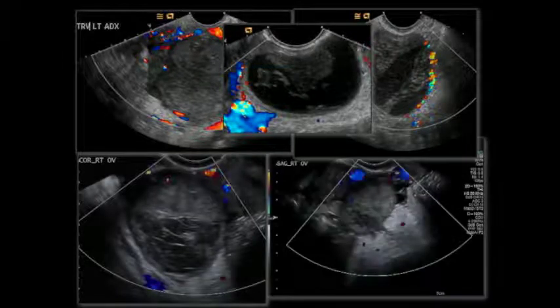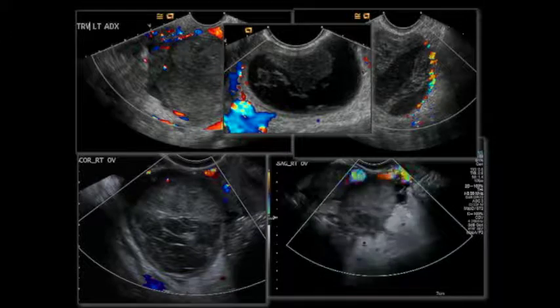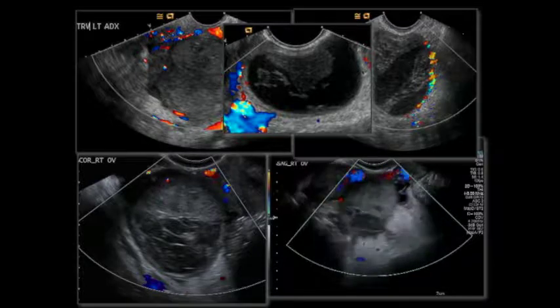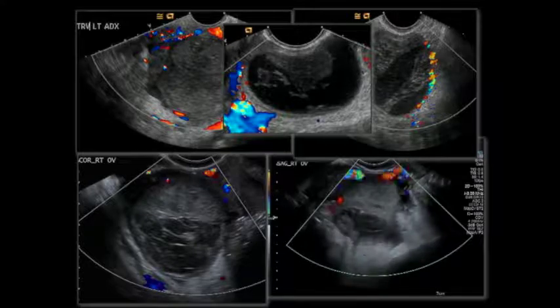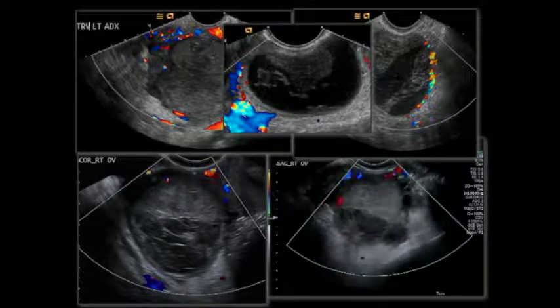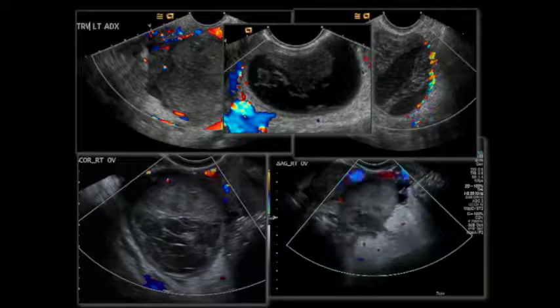In the next case here, there was both this hyperacute and a little bit older blood noted within this hemorrhagic cyst. And if you're not familiar with this appearance, unfortunately, this was misinterpreted as a dermoid, with the more echoic part being possibly the fatty component, and these fibrinous bands representing the dot-dash. And then it was thought, well, it's so big and there's acute pain, perhaps this represents torsion, and it was misinterpreted as an ovarian torsion, which does happen.